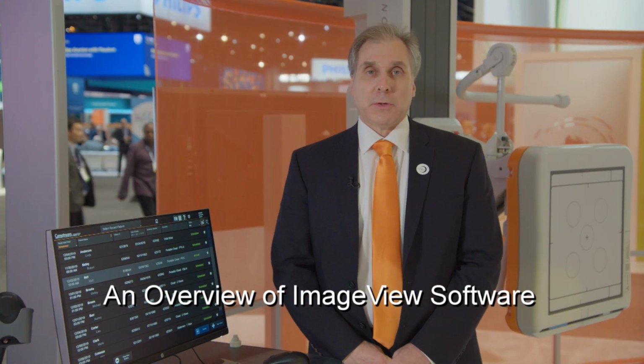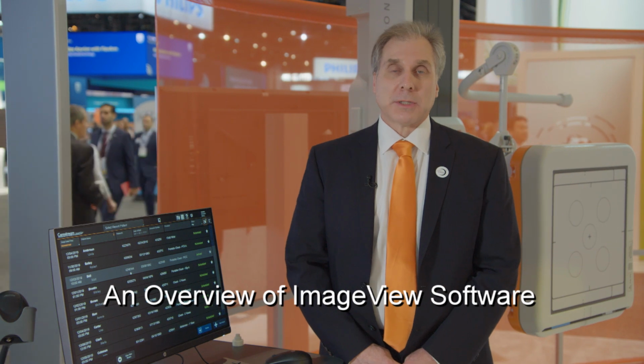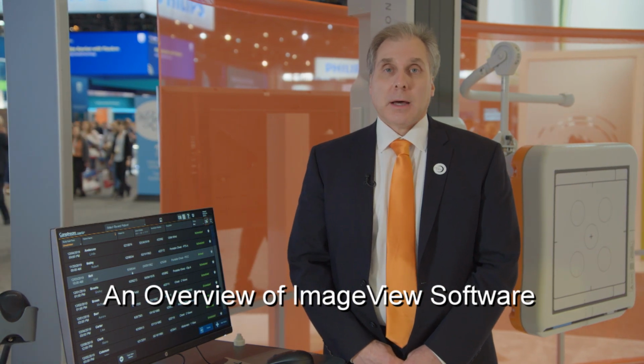Today we'll talk about ImageView, which is our latest software platform that will become available across all of our capture products. ImageView is powered by Eclipse, our image processing engine, for superb image quality and consistent presentation. It also runs on Windows 10 for the most recent security and has a number of design capabilities for improved workflow and intelligence. So let's move over to the capture workstation here to be able to look at some of the capabilities that are available.